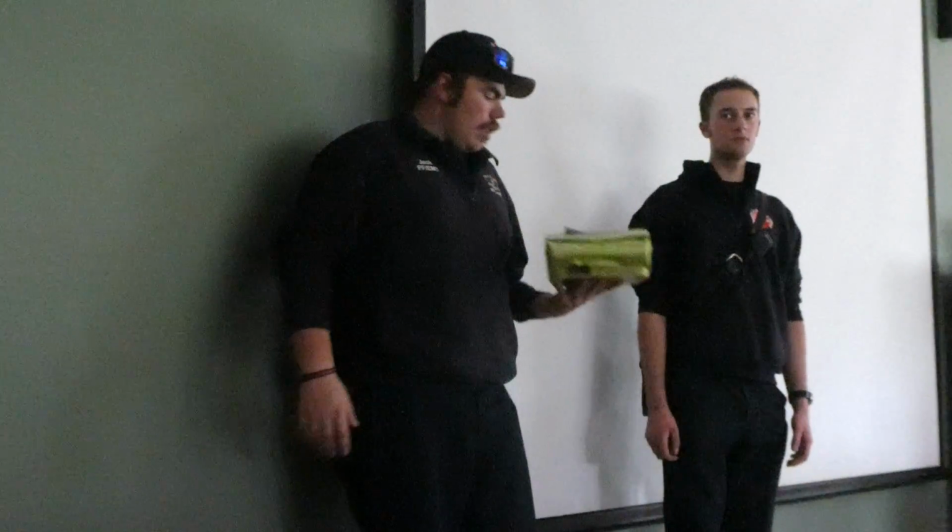So the batteries don't need to be changed every single time they're used. They need to be checked about once a year? Is that right? Somewhere in there? Yeah, every 6 months. When you check the smoke alarms, check the batteries on the AED. Okay, good idea. So if we pull a person out of the lake and they're wet, does that make a difference?